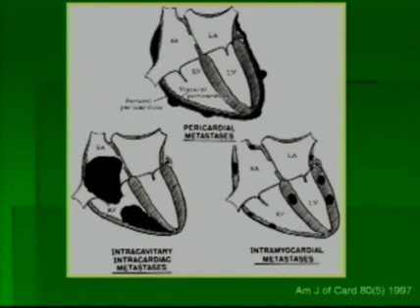When tumors go to the heart, they can show up in different places. Perhaps the most common is involvement of the pericardium. We can see here in the top middle of the screen. Then they can go to the myocardium. As you can see, multiple studded areas in black here on the lower right-hand part of the screen. And they can also show up as intracavitary tumors, either just having the tumor material lodged somewhere within the ventricular or atrial cavity and setting up shop and growing from there, or perhaps even growing in from the wall.